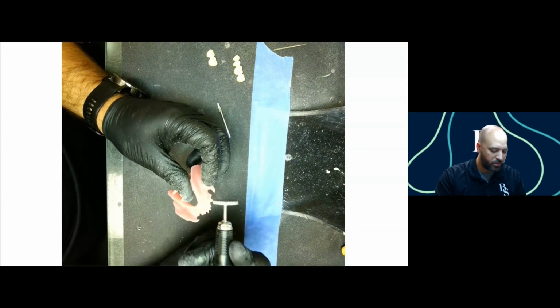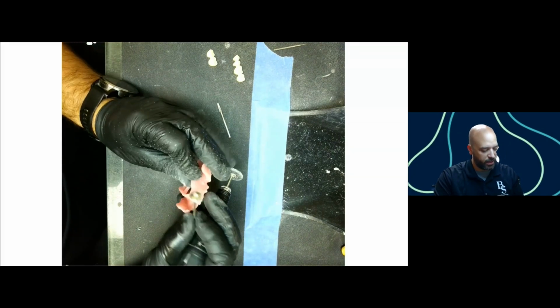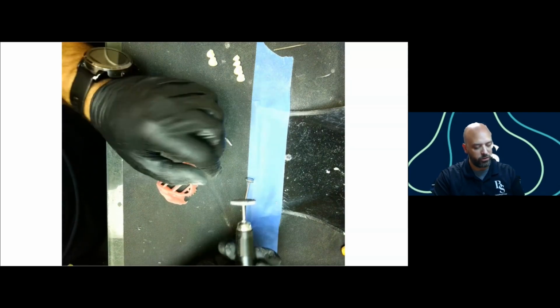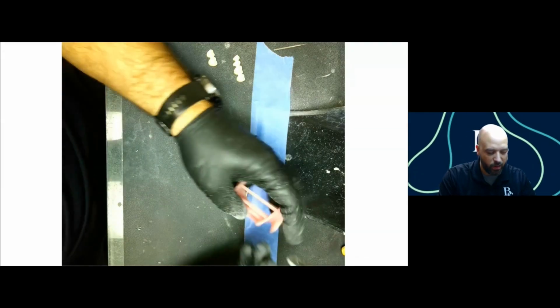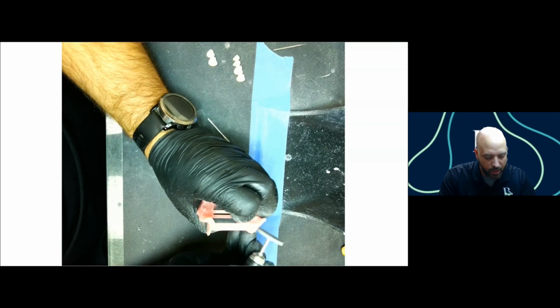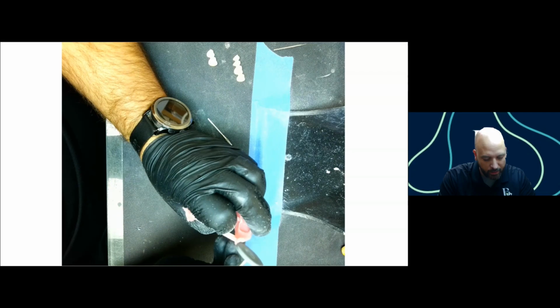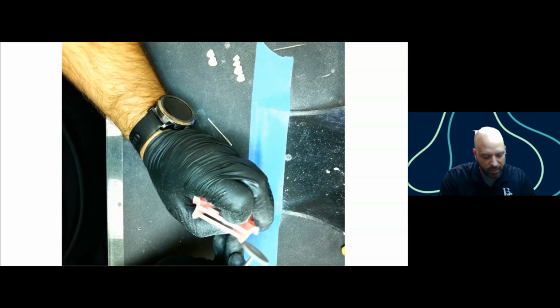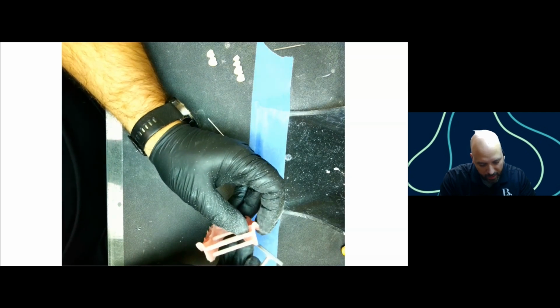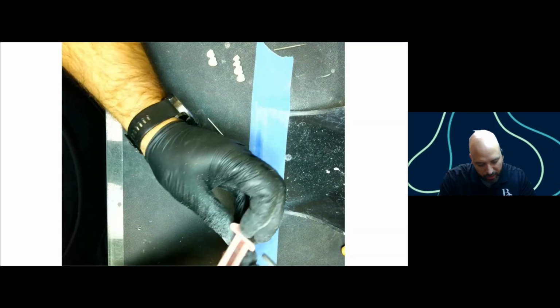If I try to go in there with this big wheel, I'm going to hit the clasp and get that off. And if it's a really, really tight area, I'll go back to my carbide and get those. But I always like to keep my old one just so I have it there. So I'm going to run through this. And this material is also really soft, so you don't need to be super aggressive with pressure or anything like that. I always keep my handpiece at about half speed, sometimes a little less than half, so that I make sure I don't over finish any of these areas.